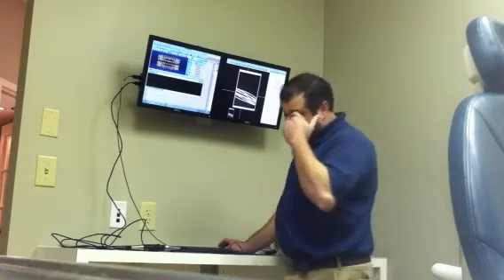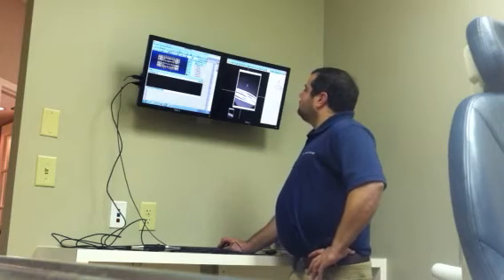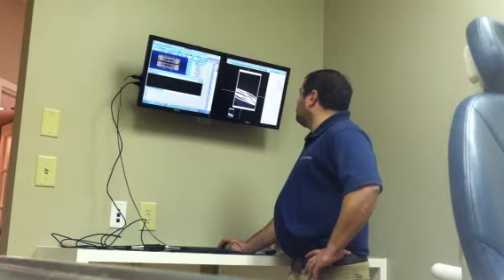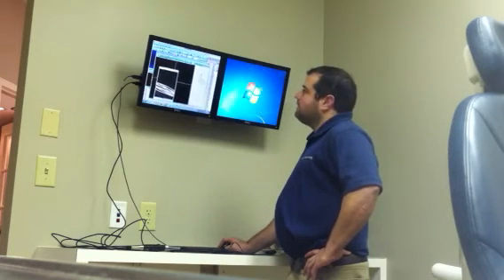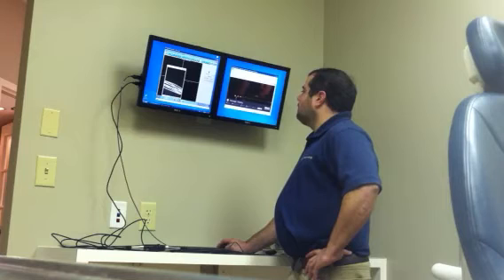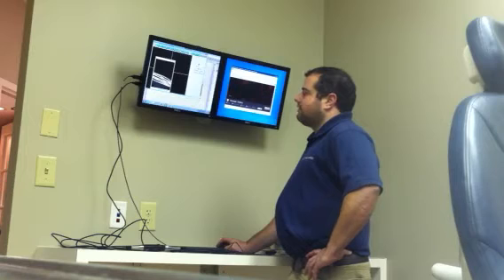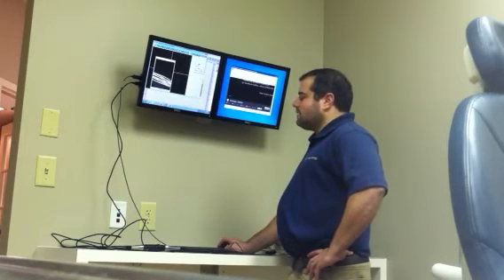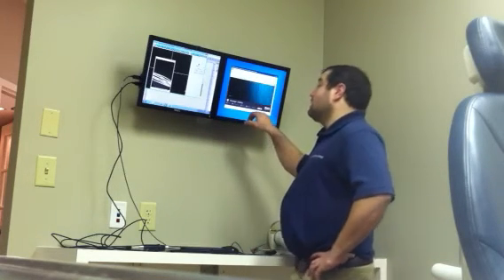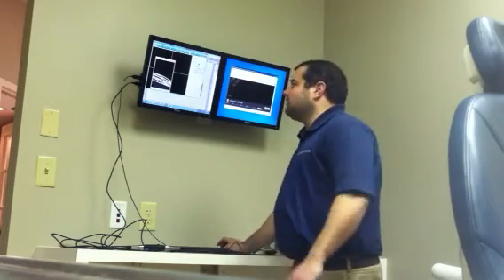And keep in mind this is also happening on the patient view monitor simultaneously. Perform all of our usual darken and lighten, and then once I was done with that, I can move Dexis back over to the primary display. I can also go back to our Hulu movie on the secondary display, and Dexis again full screen on the primary display. So it's a combination of our virtual desktop on the left, and our thin client desktop playing the Hulu movie on the right. So it's pretty easy to interchange and mix and match all of those.